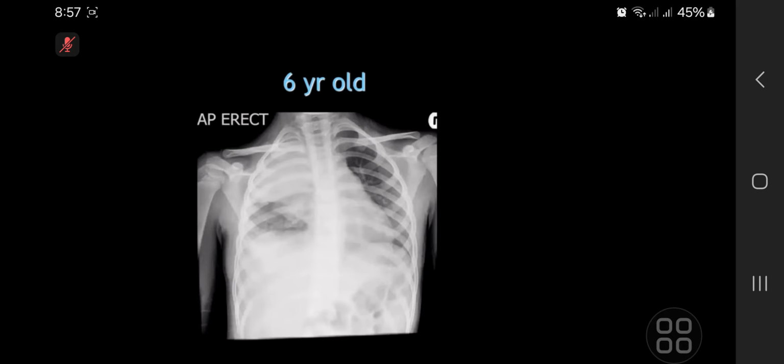There's maybe some atelectasis in the right lower zone, but the main finding is in the right upper zone and the middle zone, with the air fluid level signifying there is an air-filled cavity. If the patient is unwell, this could represent a lung abscess. I'll need to correlate clinically with the team.